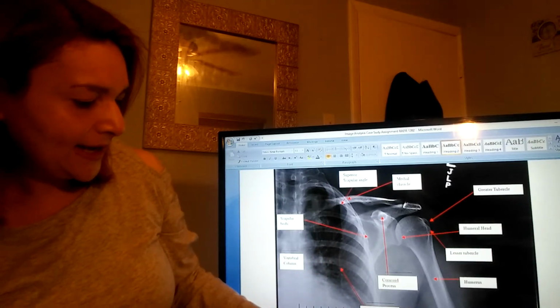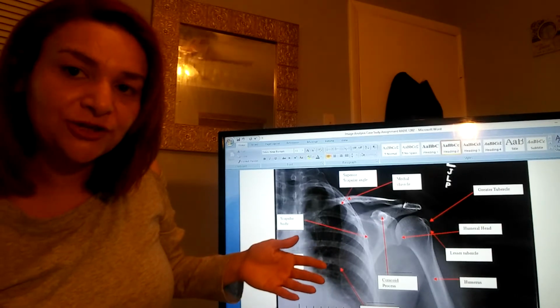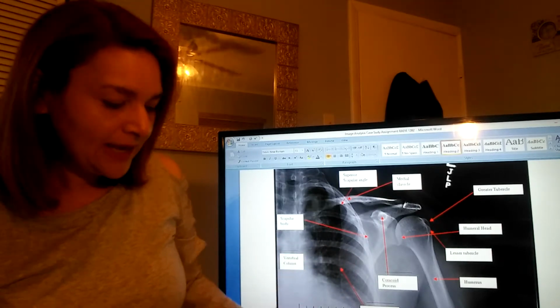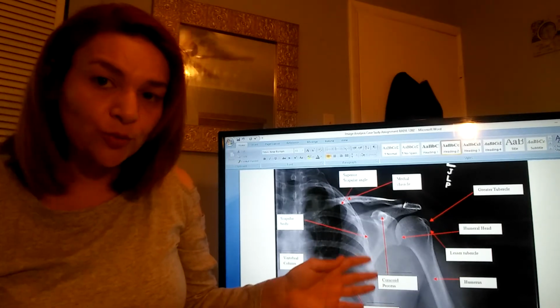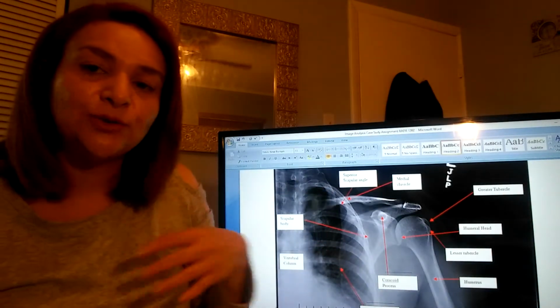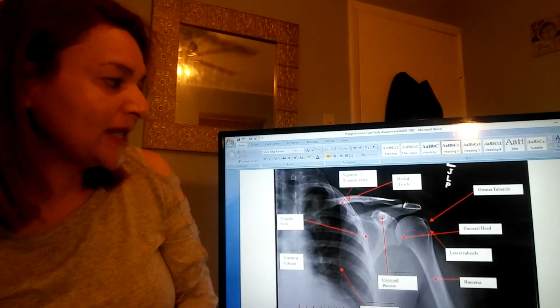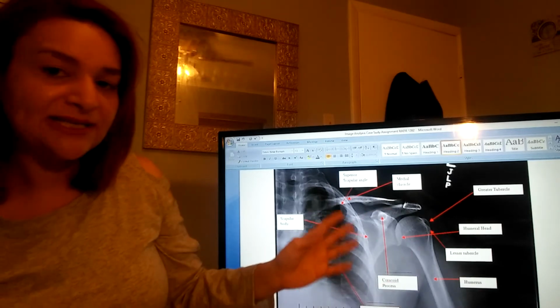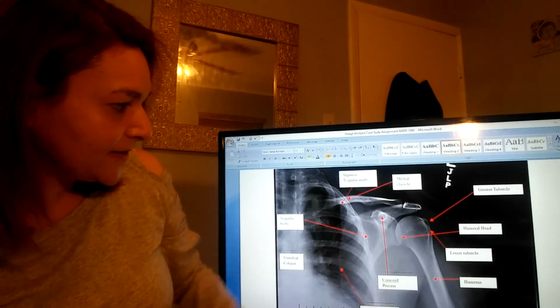Moving on, there are no artifacts in my image, which means I did ask her to remove her bra. There are no bra clamps or metal wiring of her bra. The radiologist's impression stated that there were no radiographic osseous abnormalities, which basically means there were no bone abnormalities found. So there are no fractures or damage from the car wreck. Also, I feel that my contrast was adequate, showing bony detail, which is here.